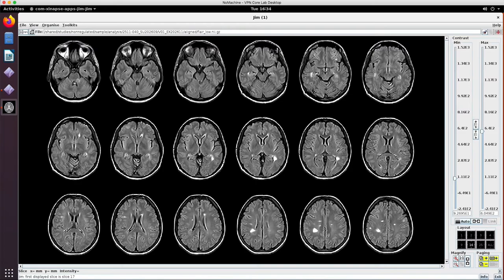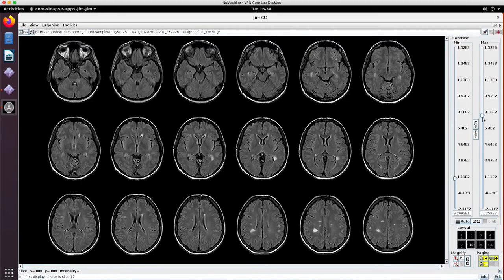Another important aspect is that dirty appearing white matter, areas that are kind of intermediate between full-blown lesion and slightly abnormal tissue, can show up. You can see these areas where there may be a little bit of brightness on the image, but not clear lesion. And the line between dirty appearing white matter and lesion is not generally well defined. So that can be a challenge as well.